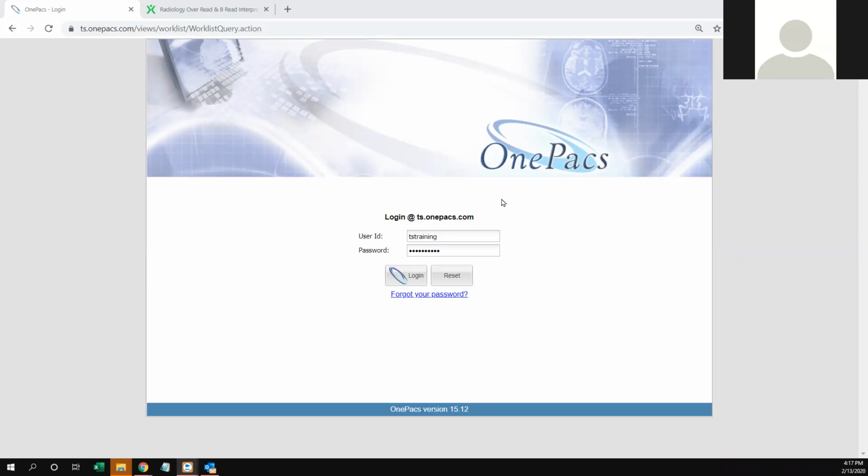Okay, so what you're seeing here is the OnePacs website. Once you push your studies over to us, you'll go to ts.onepacs.com. Let me make sure I'm recording this. Give me 1 second. Okay.